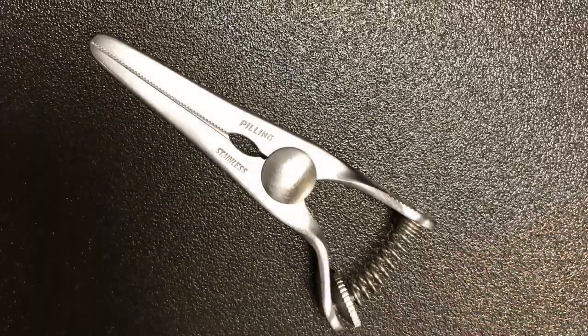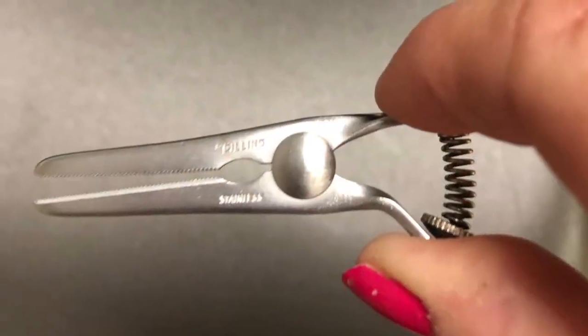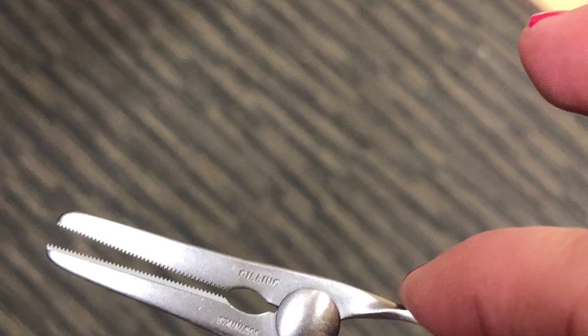The bulldog clamp. This is used for cardiovascular surgeries. It's used to clamp blood vessels in like a spring-like action. It stops the blood flow without damaging the blood vessels while controlling or suturing is performed.